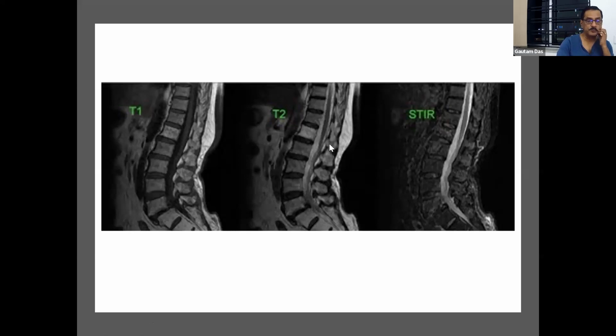I'm coming to that later on. But here you have to remember, in T1 only fat looks white. And you see here it is water, no fat, very little fat, so this is looking black. The structures which don't have any fat will look black in T1.